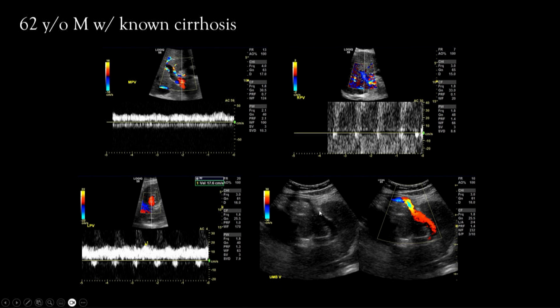This patient had this really large recanalized umbilical vein, and really all the portal venous flow was headed toward that vein. So the portal venous flow in from the bowel was coming through the main and going into the left, and then on the right side, the flow going into the right hemiliver from the hepatic artery, crossing through the sinusoids, was just coming out backwards through the right portal vein, crossing over into the left portal vein and flowing out of the liver in that fashion.